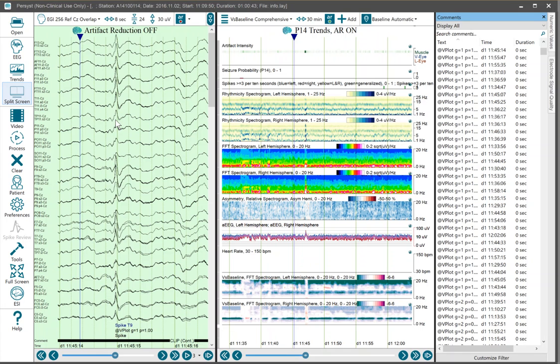So you've got 3 channels, sometimes 2, sometimes 4, but they're all adjacent to each other, and they've been laid one on top of the other. So if you have a high resolution screen and you're spreading the channels out, what this will allow you to do is to view all of the inputs in that 256 channel recording and show them in their entirety. And that's the reason why I picked that Beth Israel extended 1010 nomenclature, is that it would also allow you to use this full 256 channel montage overlapping adjacent channels. This is one way to do it.